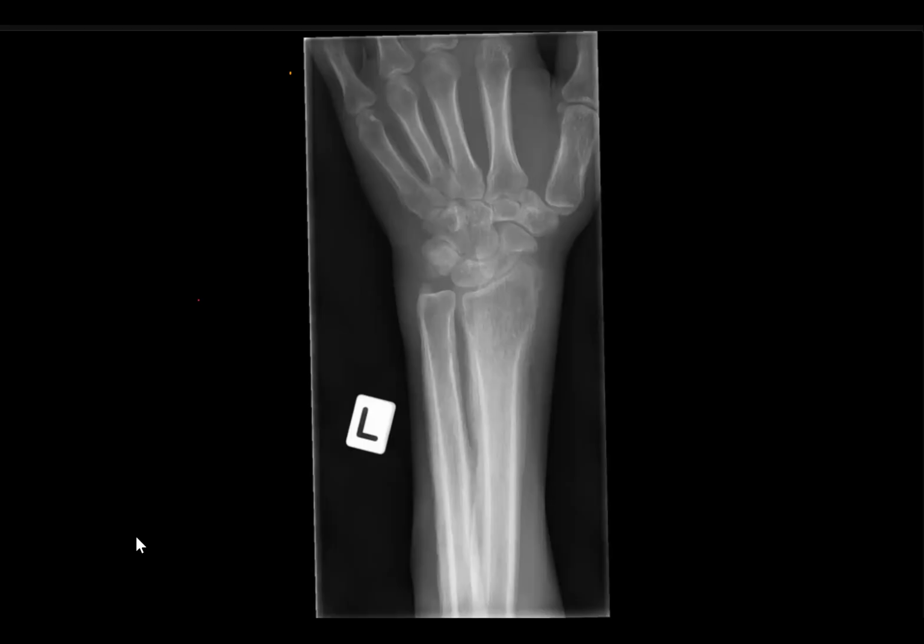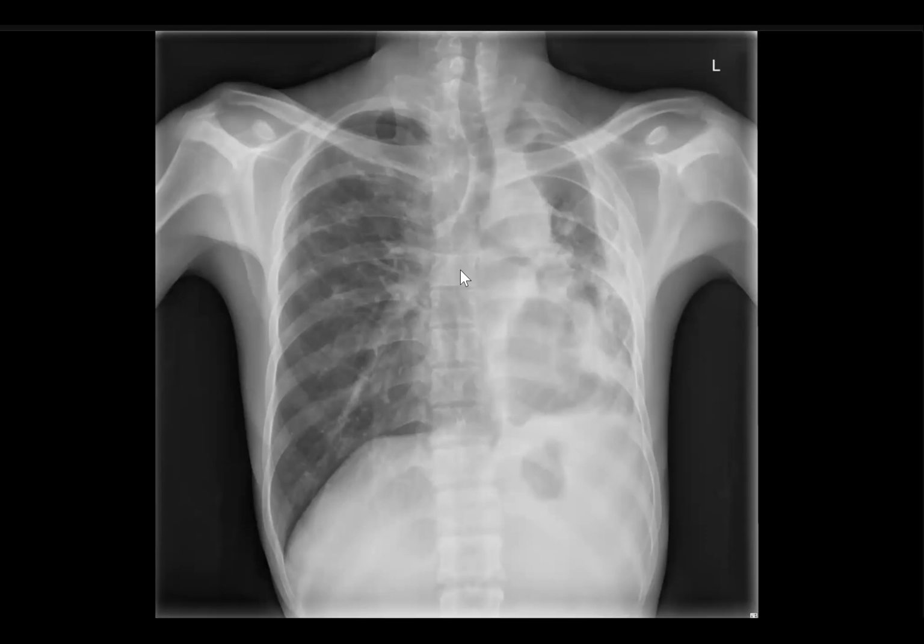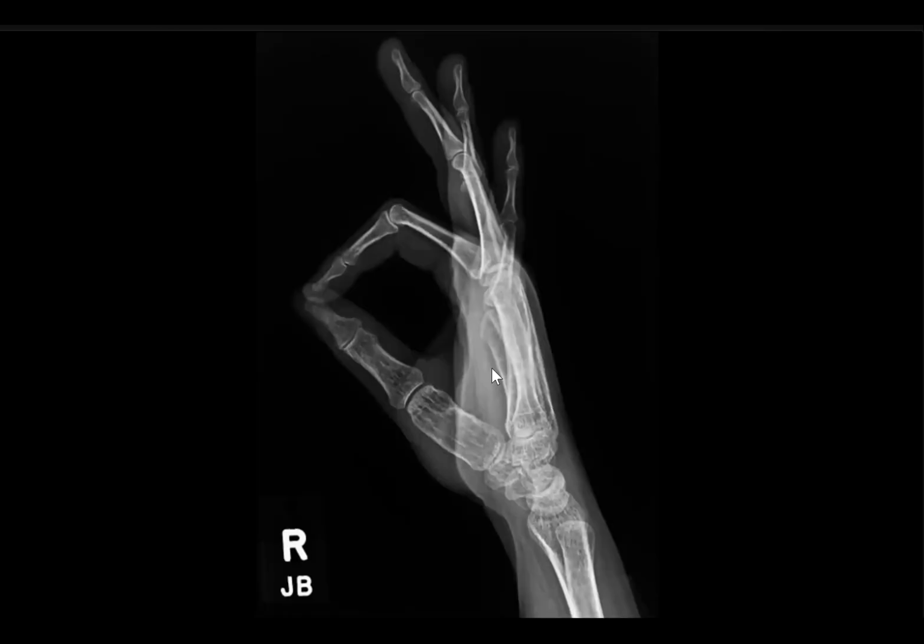Sir, it is a florid periosteal reaction which is bony. And I would like to know the age of the patient, any associated lung history, or if the patient is not a known case, any recent chest related symptoms. Yes, this is a classic hypertrophic osteoarthropathy, and the patient may already have some lung disease, maybe fibrotic lung disease.